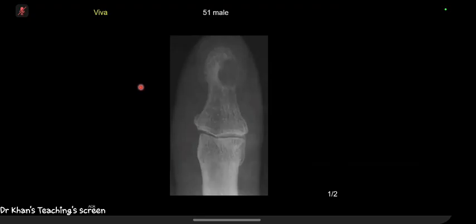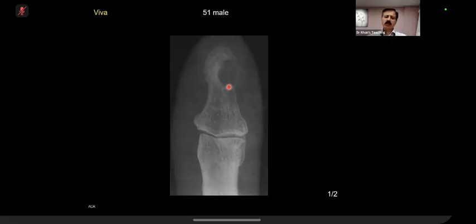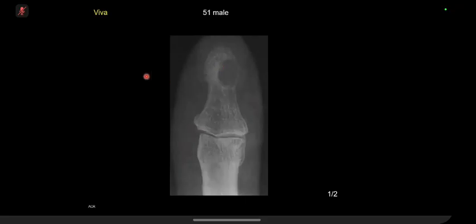It's a thumb DP radiograph, a digit of thumb, which is demonstrating an eccentric lucent lesion with sclerotic margin in the tuft, with a bit of fragment within it. But there is nothing inside, so don't worry about it. There's a breach of cortex here as well, so there's a fracture through it as well. Breach of cortex, okay, this was artifactual. There is no breach. Okay.